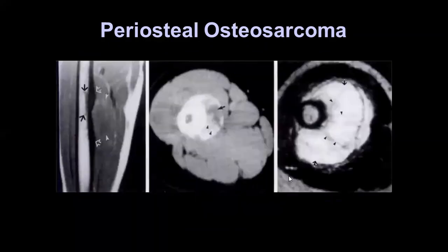Perfect, Marwa. Okay. This is the appearance in MRI. What is the important description to mention here? What is the most important? Yes, here. Yeah, the periosteum. Perfect, Marwa. Yes. So aggressive periosteal reaction. Nice. That's the most important thing to mention. So this is the mark. We'll take the mark in this.